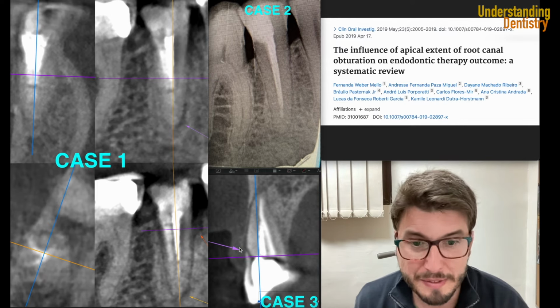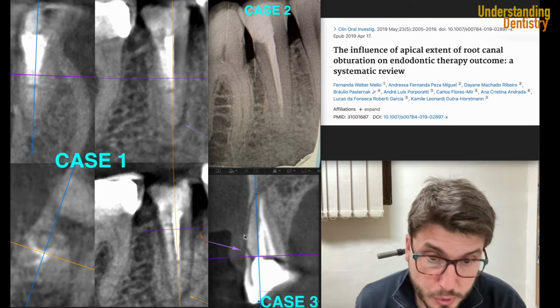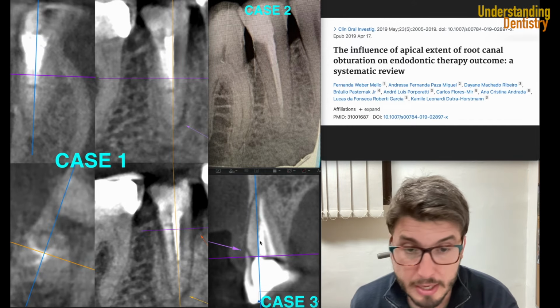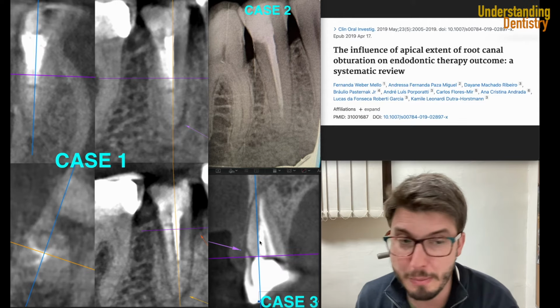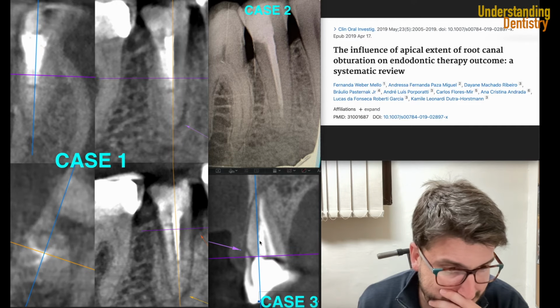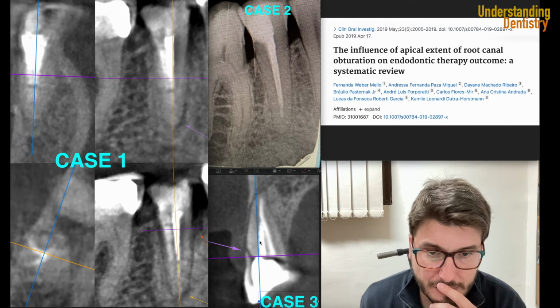So you have this situation here. Now there is a fracture, and this contributes. Now maybe we have a longer fracture, even a vertical fracture like this. So we are going to analyze all the three planes. If you guys don't remember how to navigate through CBCT properly, the link will be on the top right corner of this screen. It will show at some point on this video.